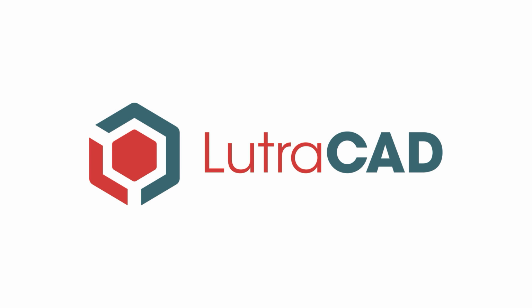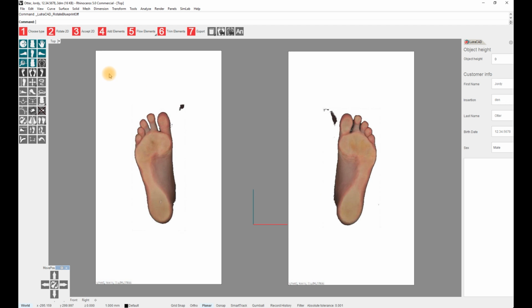This is a video about designing an insole based on a 2D scan. You will find the steps needed for designing an insole from start to finish at the top of the toolbar. As you can see in this video, it only takes 7 steps.